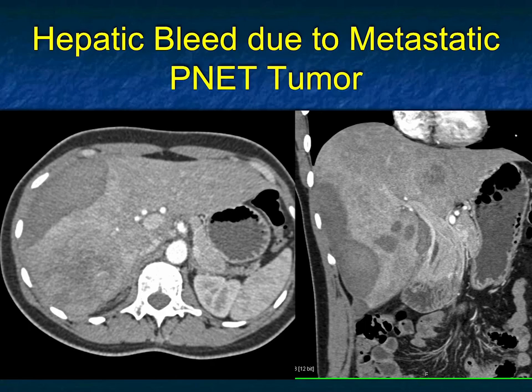I mentioned Mets to you, but the number of times I've seen Mets spontaneously bleed, it's this case and maybe a couple others. So again, differential diagnosis is something you've got to think about. Look at the rest of the scan. The fact is, I didn't see another mass. If I saw a mass in a different organ, then metastasis, surely if it was renal cell, for example, I would have gone that way. But this is just a wonderful case of metastatic neuroendocrine tumor to the patient's liver. Okay, what a great case.